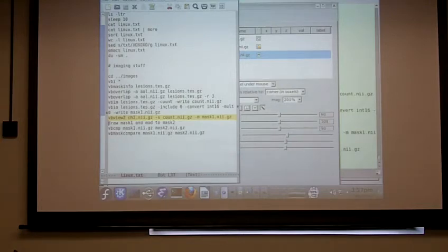Some programs now that use Nifti format will actually pay attention to Nifti's orientation information and flip the file if it indicates that left is left or right is right or left is right. They'll flip it when appropriate. At some point, Voxel might make that an option. At this point, I find it very difficult to keep track of which program is doing what in which version, and I think it's most helpful to have some other way of verifying that the images you're looking at have the orientation you think. But for right now, Voxel just shows you the images in the order they're stored in the file.